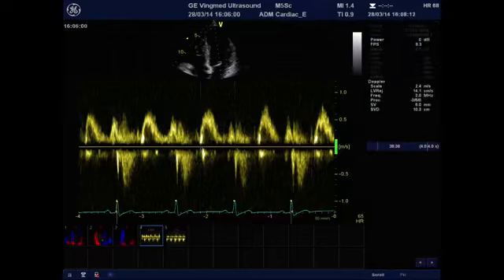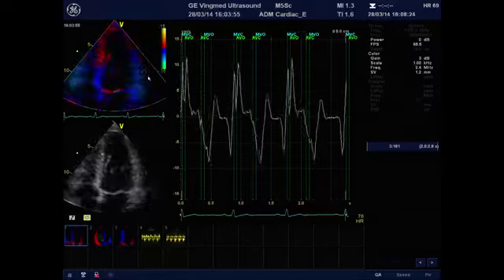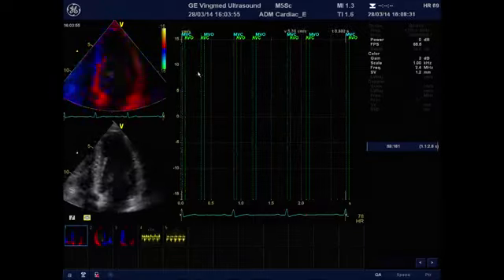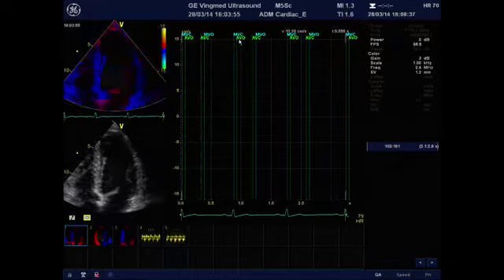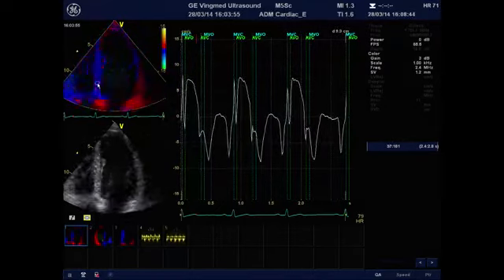And now we are ready for analyzing tissue Doppler data. Depending on the machine, you will find different programs. Here you see one of these programs, and what you can see is the loop we have acquired a few minutes ago. You see already the timing implanted into the display for the curves. So we know already when the aortic valve is opening and closing and when the mitral valve is opening and closing. And we have a lot of tissue Doppler data now from all the image.